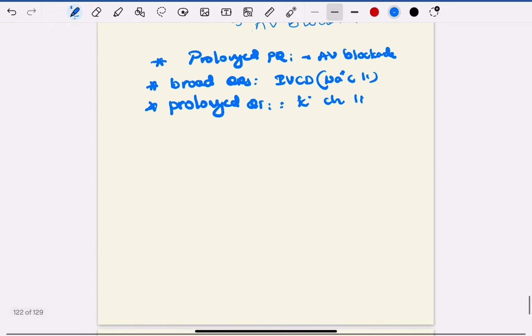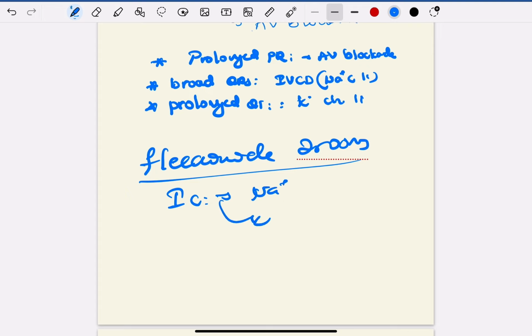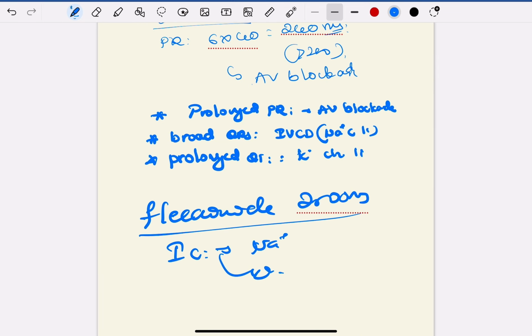So if you apply this, and if you dig the history and take the history properly, the patient gave history of consumption of around 2500 milligrams of flecainide, oral flecainide immediate release formulation. So flecainide is nothing but your class 1C antiarrhythmic, which has the property of sodium and potassium channel blockade. Because of this the patient is having this ECG pattern. Sodium channel blockade is also seen in TCA toxicity.